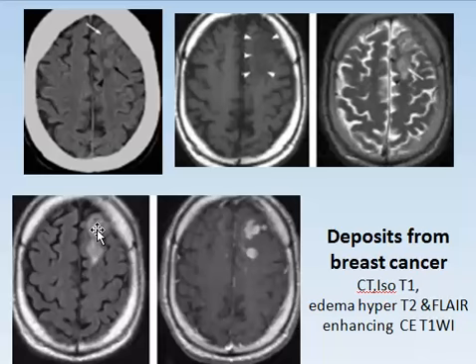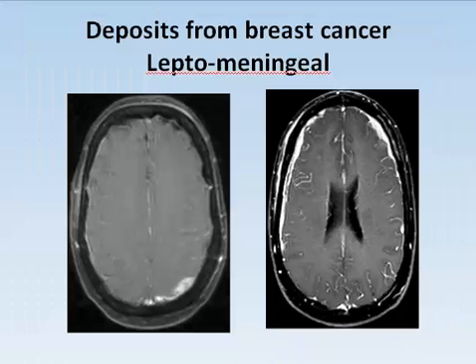In FLAIR it will manifest edema, and after contrast it will show enhancement of the lesions themselves as intra-axial lesions.